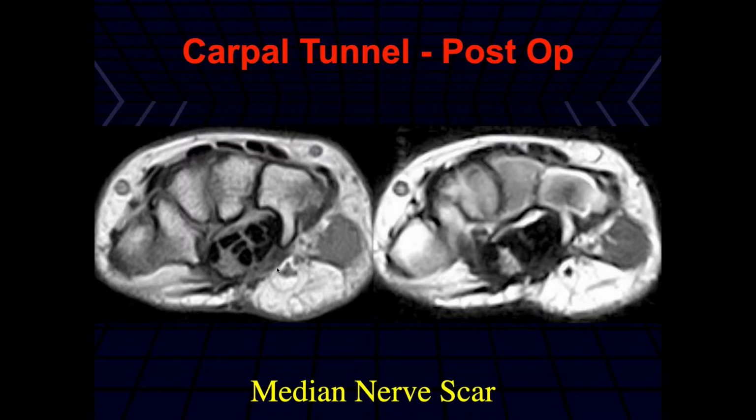So again, this is a carpal tunnel post-op. You can see a defect at the hook of the hamate along the flexor retinaculum. There's a little bit of enlargement of the median nerve right there, and there's some scar tissue, but not too bad. Notice the edges are not very smooth; they're a little stellate. This is typically what occurs when the scar attaches to the nerve and retracts, and is often seen when you get recurrent symptoms. Okay. With nerve involvement with the scars, so it's not what we like to see. But it also doesn't correlate real well with symptoms.